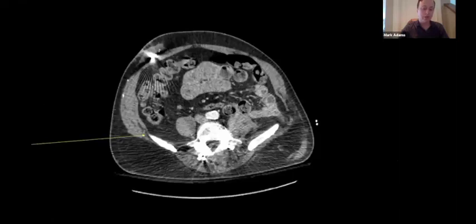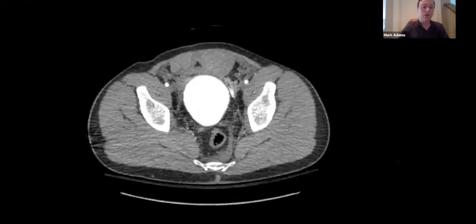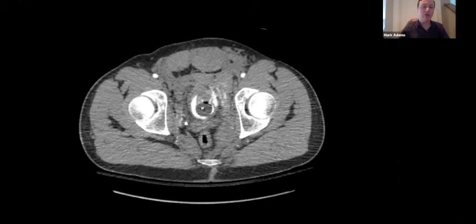In this example, we see the abdominal wall attaching nicely to the ilium, but on this side, we see a traumatic herniation. Here we see a swollen left rectus muscle, a bladder full of contrast, and there's extravasation on the left and extravasation inferiorly as well. These are just a few examples, but by getting to know our patient in this way, we can anticipate problems early and have comprehensive plans as a result.